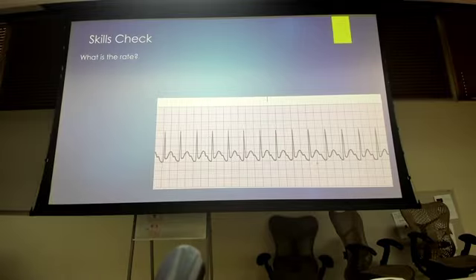Okay. What about this one? Miller. Sam Miller. Okay, sir. About 140, you say? Okay. And so if we look here, we can see that there's an R pretty much right on that dark line. So we've got 300, we've got 150, and we're just a little shy of 150, but way more than 100. So yeah, 140 or so, probably okay.